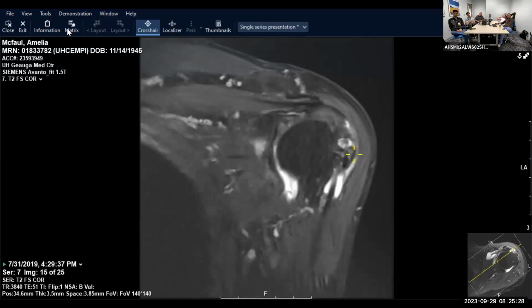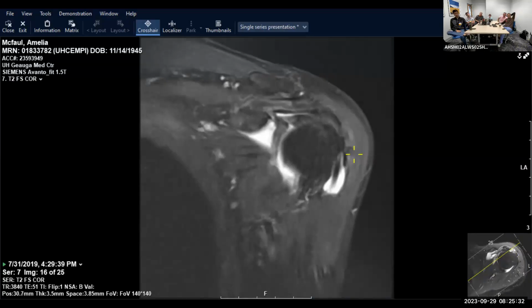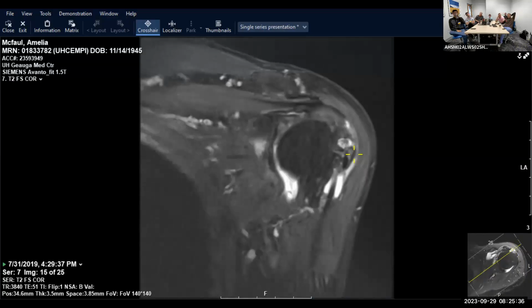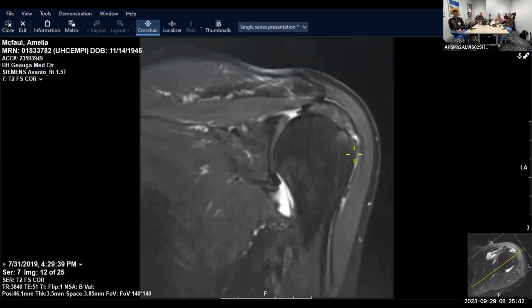which is important for you guys and our orthopedic colleagues. So sometimes I'm doing it on the coronal plane, and I know my slice thickness is down here. You can always pay attention to that. Then you can just count how many slices you see the tear on and multiply it by this number. So let's say it's 1, 2, 3 or so. So then it's 10-ish millimeters.